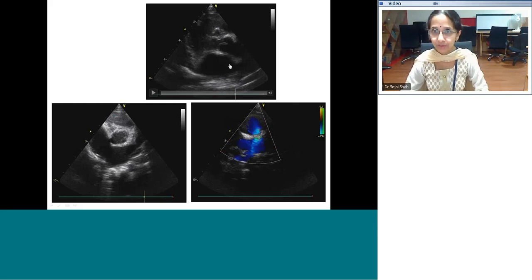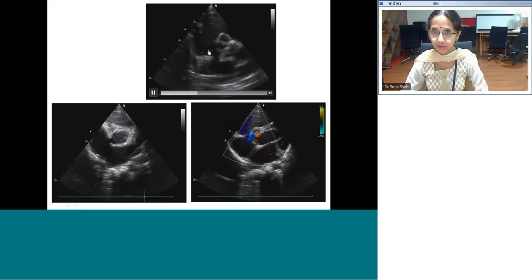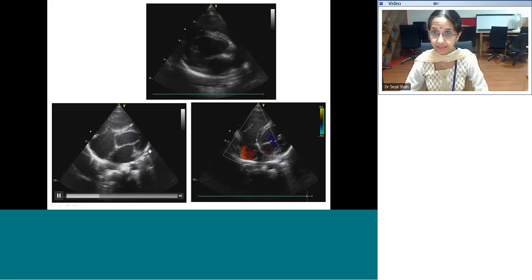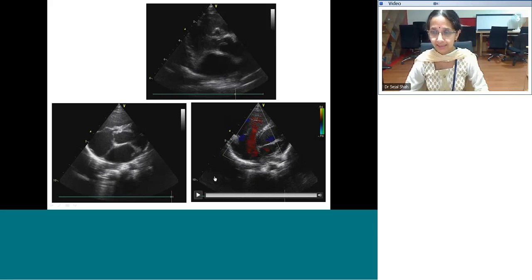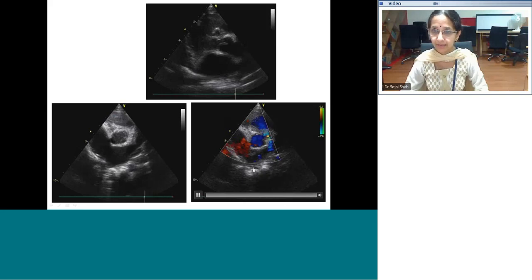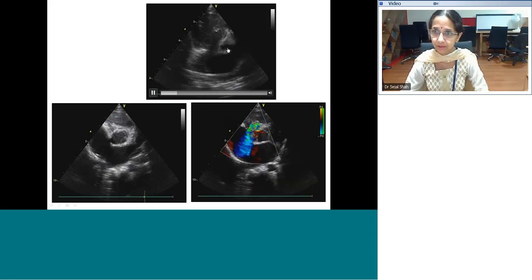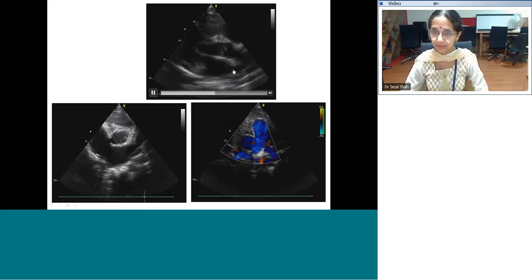See, this is the aortic valve. This is a structure which is below the aortic valve. So that's how you would differentiate a VSD and any communication through the sinus. So this is what we have. So what would you call it? You're saying it's aorta to RA. And see here, it's not the aorta. It's a structure below the aorta. So what will you define this entity as?